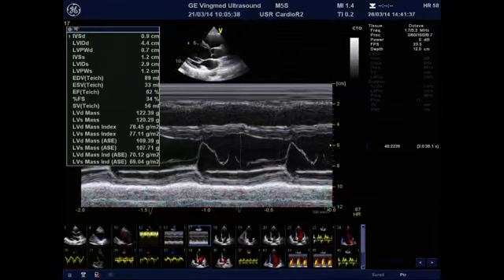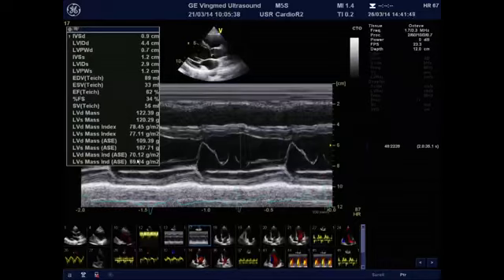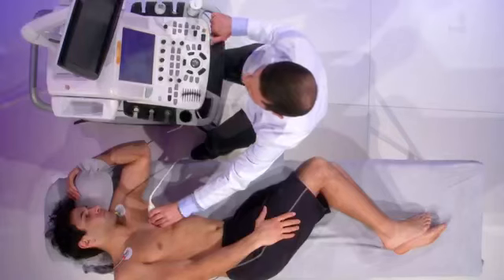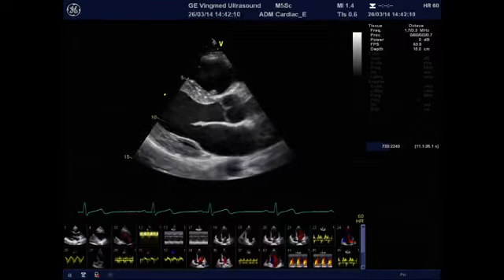The left ventricular mass will then be indexed to the body surface area of the patient, and based on the value that we get, we know whether the patient has a normal LV mass or whether there is left ventricular hypertrophy. As I said, when present, this is an argument favoring and supporting the diagnosis of diastolic dysfunction, together with the other signs which we will talk about later.